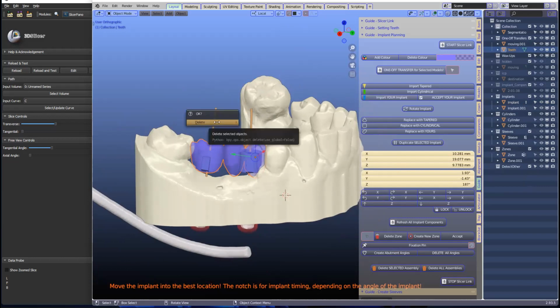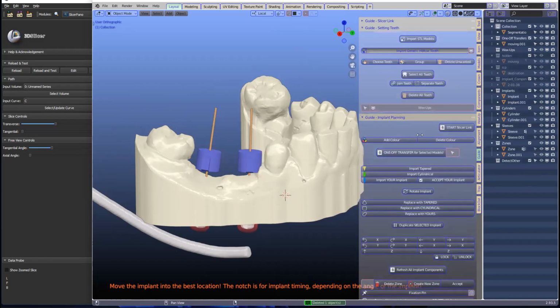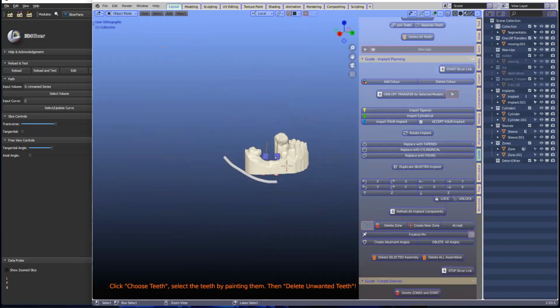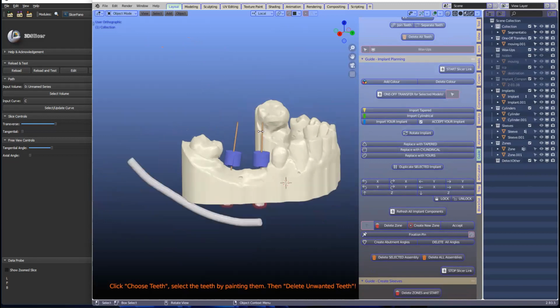Look, I would say just delete it, bring in 2 other teeth from the wax-up, and then verify that the implants are in the correct position, because you want the cylinders to come out of the occlusal surface. And then, of course, you'd shift them a little bit here and there. So just go back and put some other ones in there.